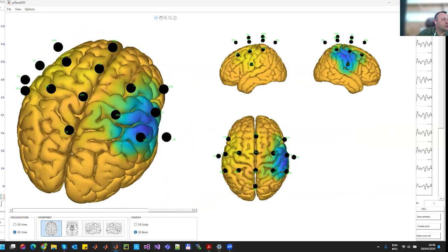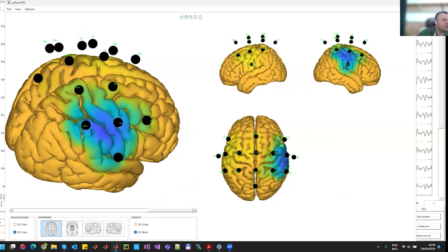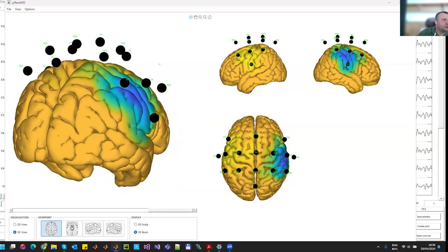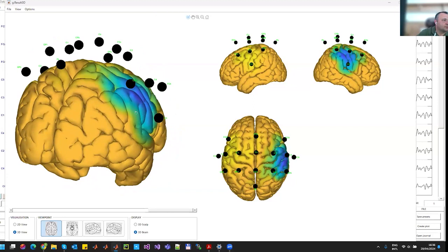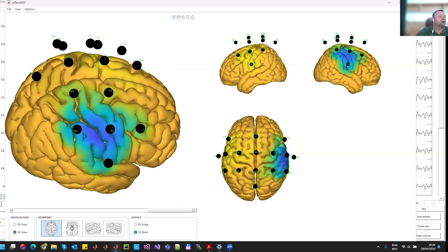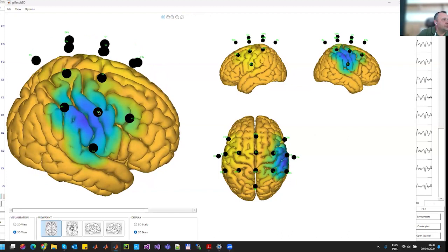And now in this part, we can nicely see it beneath C4 and directly on the brain. The electrodes are located a couple of millimeters distance from the brain. And as I told you, you can see very nicely the activation, the CSP beneath the electrode, beneath C4.